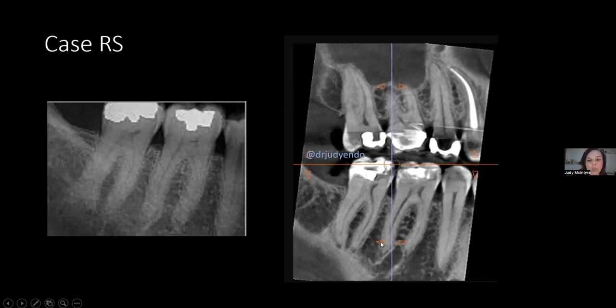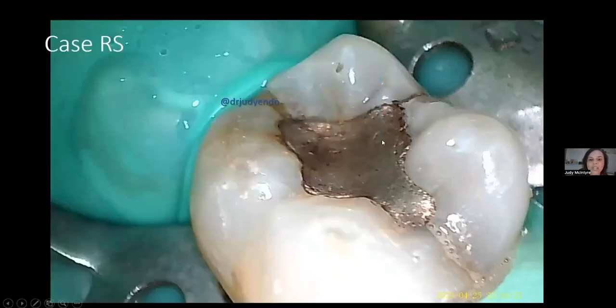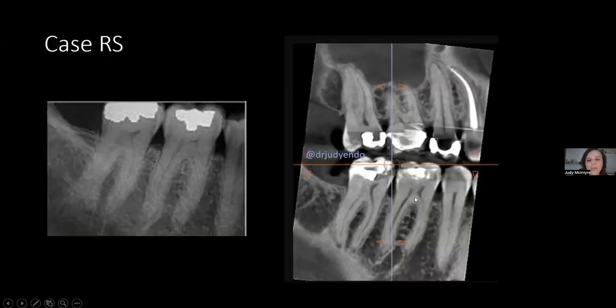He has long roots, and after this tooth is crowned, despite these cracks and craze lines that seem so scary to our eyes, only with the 3D scan information and knowing that his horizontal bone has not been affected, this is not a significant angular defect.